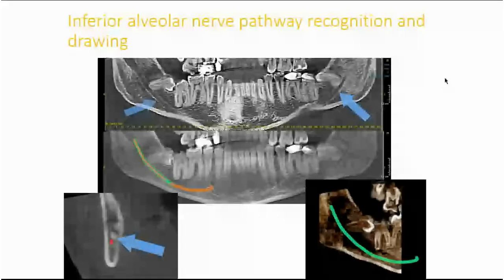So it was recognized by the developers, and they gave us the possibility to recognize the roof or the bottom of the nerve canal in transversal projection or on this panoramic projection, and then to draw the line. And then in all kinds of radiological or three-dimensional projections, we are much more capable and much more confident that we can really assess the importance of the nerve, or assess the available bony structures.